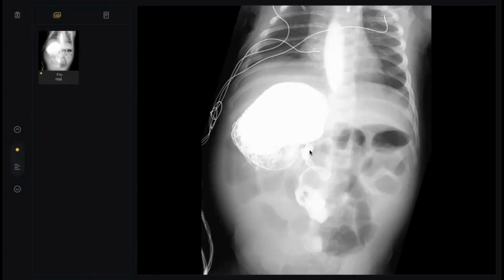On non-rotation, the whole duodenal-jejunal junction is on the right side. And malrotation, that some of the bowel loops have a reversal of their relation.